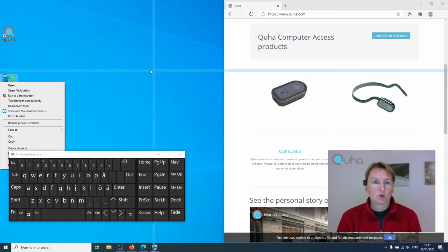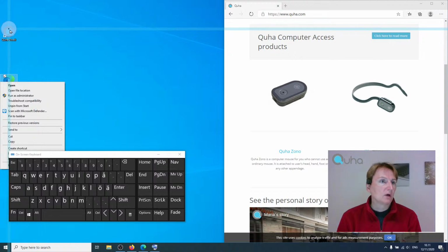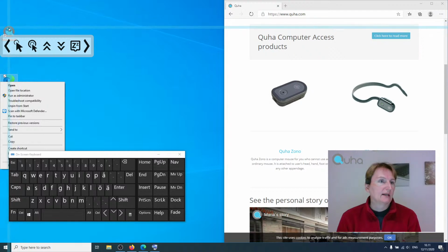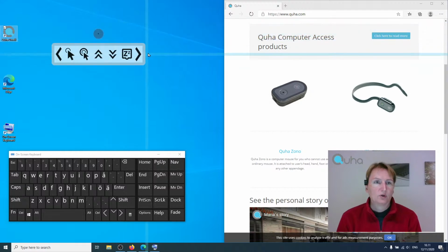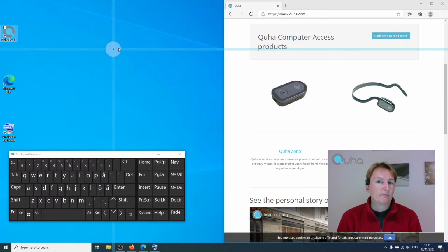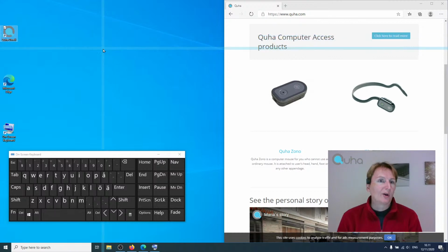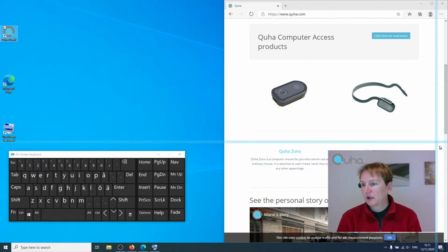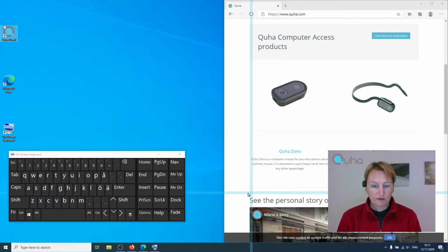So that's what happens. The activity that you are doing is always concentrating on the position where you are idling. If I idle here, it would make the feature happen exactly on that position there. And you notice that I don't really need to move my cursor very much, because the Instant Dwell menu pops up very close to the position. With traditional dwell clickers you would typically pick the menu from the side of the bar or wherever you have located the menu, but in this case it happens like this.